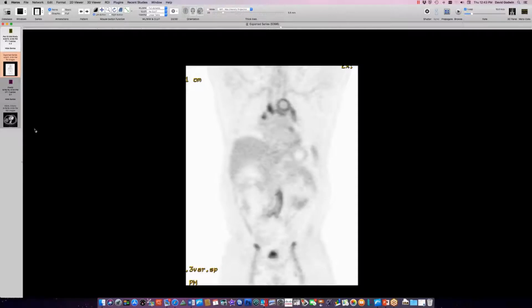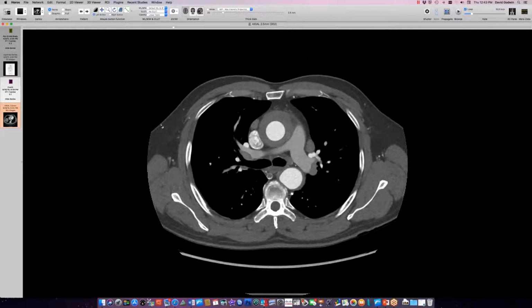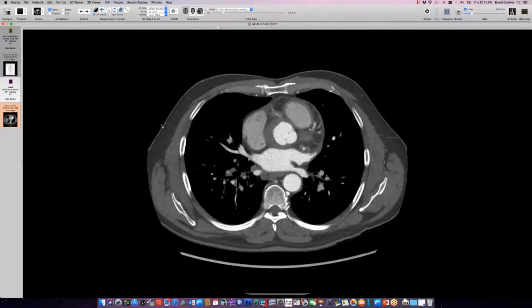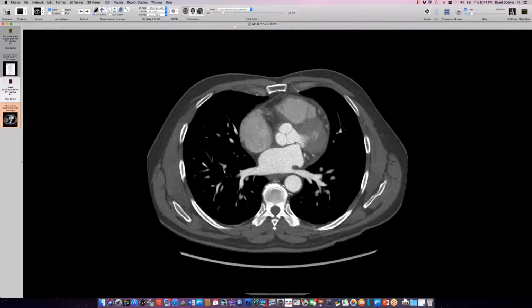At least when you scroll through quickly, the right coronary artery on the CT. Yeah. That's a very good point, because clinically he has coronary artery involvement. And I think as you were scrolling through, the right coronary just looked like it had circumferential soft tissue thickening. Circumflex. Even the circumflex too, but yeah, look at the RCA there. Yes. And it was more in the mid portion as you were scrolling down where it looked like that as well. Yeah, yes. Right there.